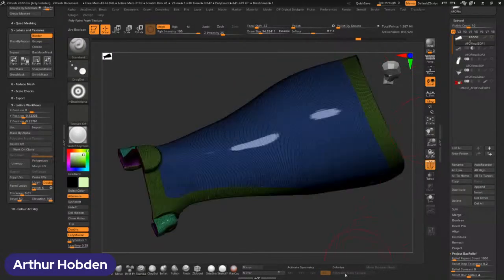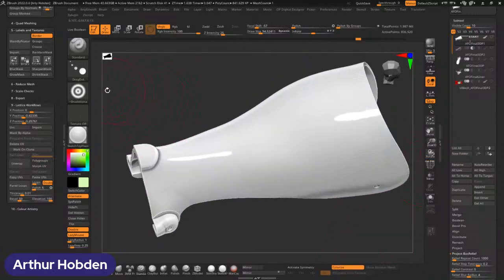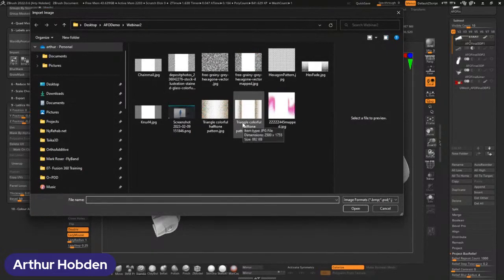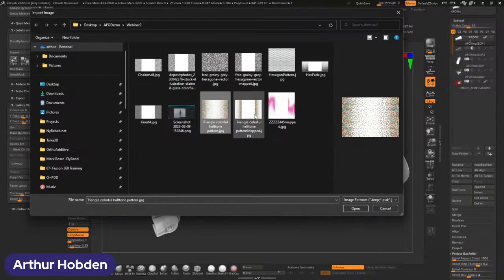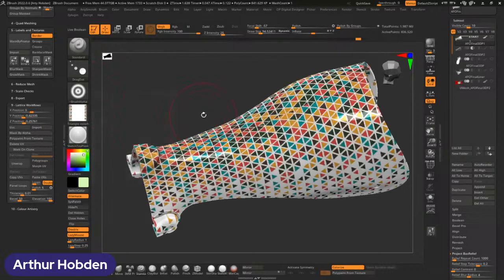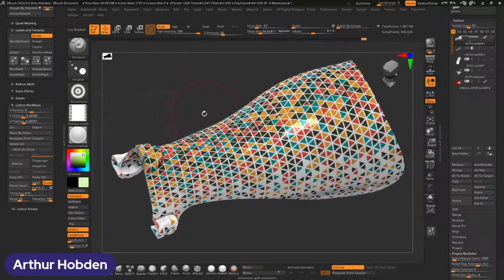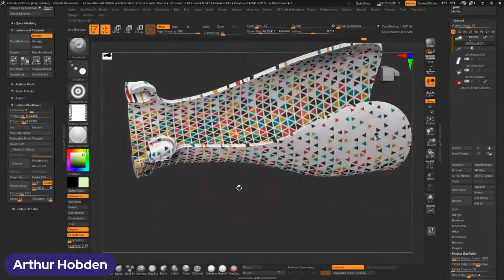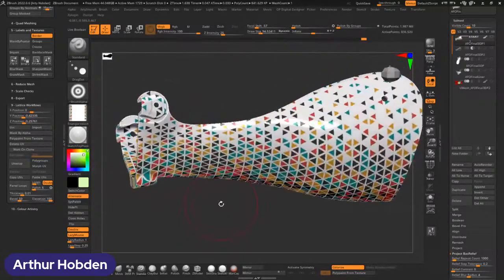Turn on our fill again, turn on our colorize. We can texture and wrap just like we were with those maps for alphas and for latticing. So what if I took something like this where I've again mapped it, I'm going to apply it, and then I'm going to UVC my part again, and I'm going to poly paint this time. So just like that, it's really easy to take a color file or an image and wrap it around a part.